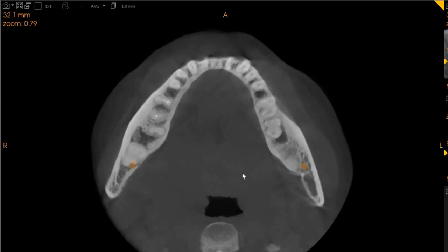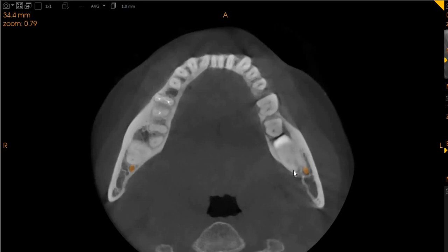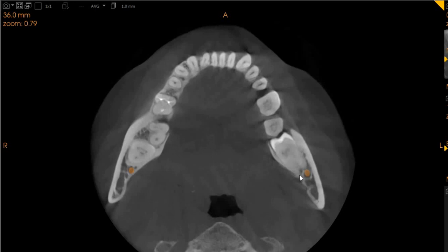Here also you can see this is where the osteosclerotic bone or the radiopaque bone shows first, then we see the ankylosed tooth, and here also we can see that there is a small feeder vessel developing here. So this is also something to be kept in mind when extracting, if extracting, because this is an area which will lead to a lot of bleeding as well.